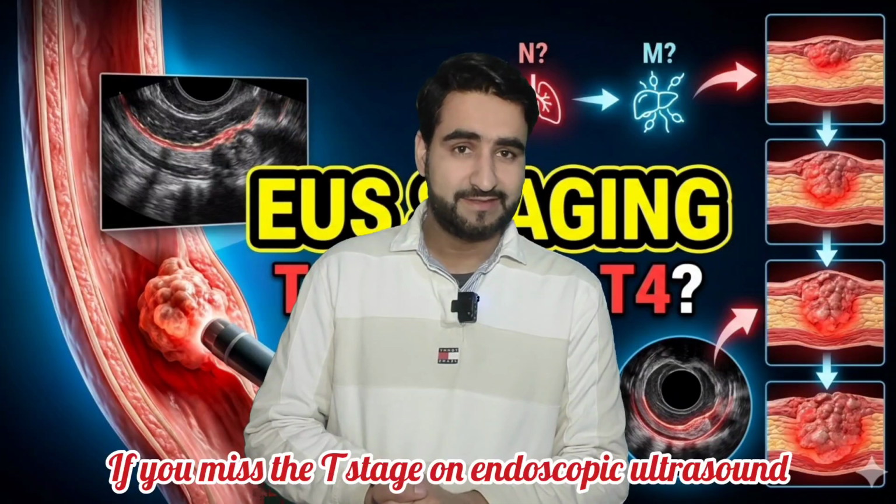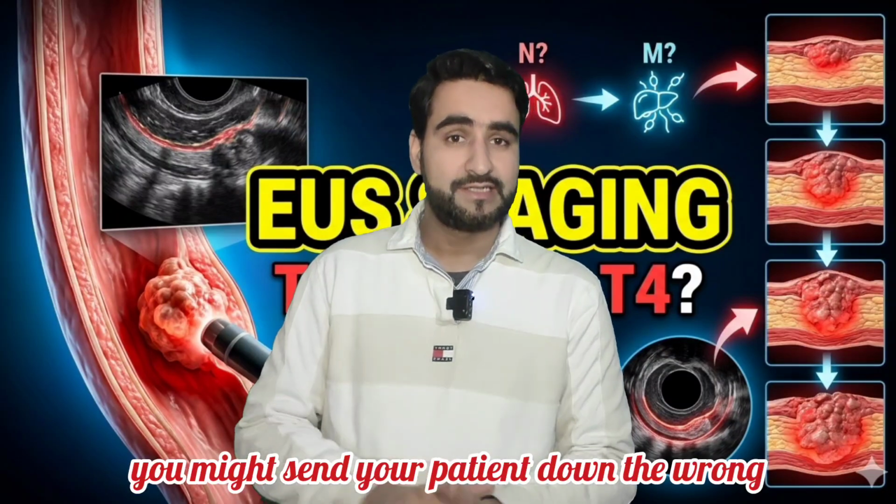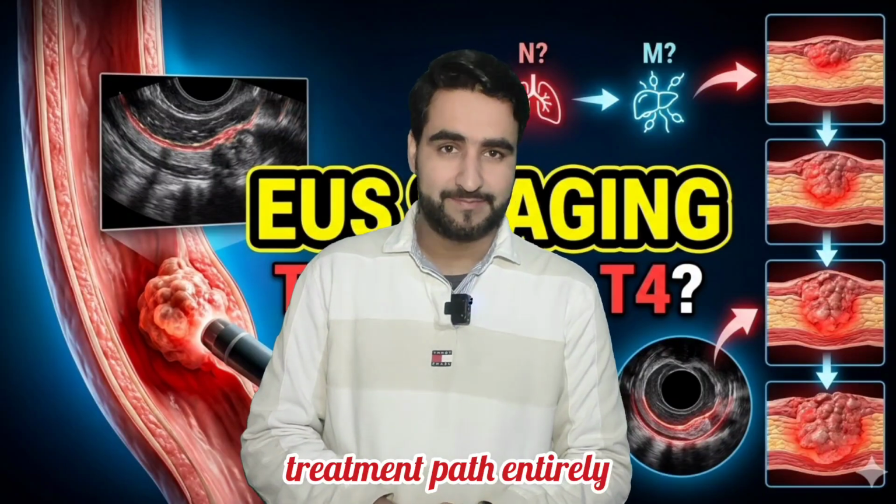If you miss the T stage on endoscopic ultrasound, you might send your patient down the wrong treatment path entirely.